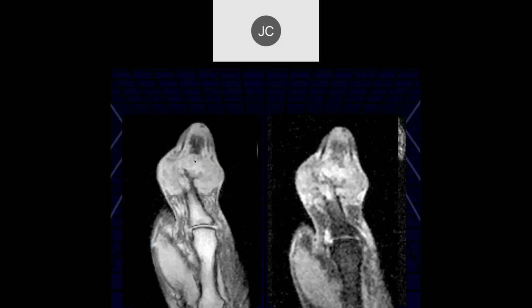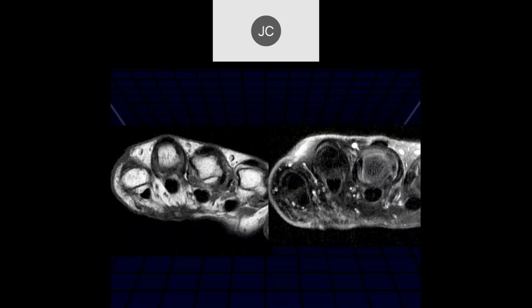So when you see a discombobulated joint, you think it could possibly be neuropathic disease, but generally with neuropathic disease you don't just get these large soft tissue masses. So this is much more in the category of gout. And this was another gout. Okay, Tayson.